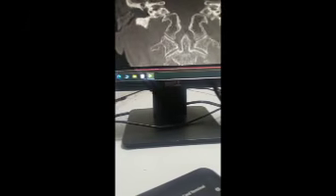This is the superior semicircular canal. This is the lateral semicircular canal, and both these semicircular canals combine to form the ear vestibule. As seen, this is the ear vestibule. Okay, and here you can see the posterior semicircular canal. This is the posterior semicircular canal that comes and opens into the ear vestibule.